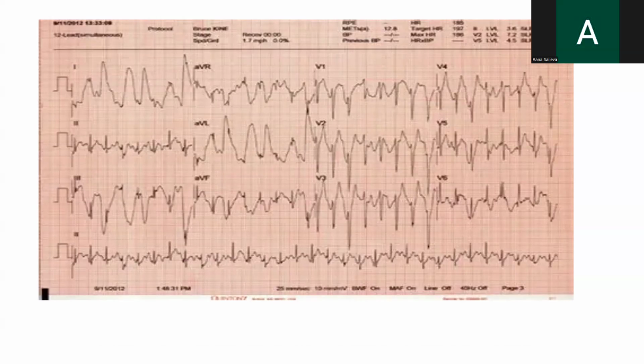So remember, before interpreting the heart, always verify the basics. This step protects you from misdiagnosis and ensures that everything you analyze afterward is accurate and meaningful.